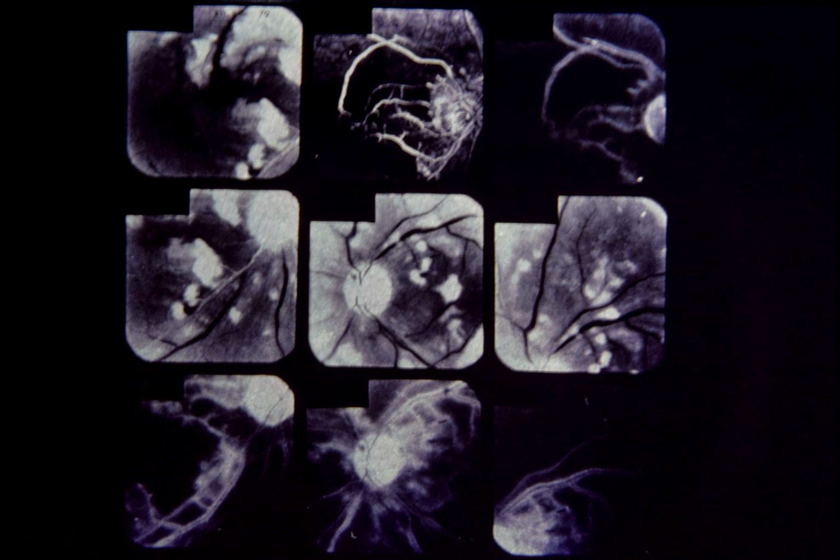Upper center, note marked capillary non-perfusion in areas corresponding to cotton wool spots. Upper right, reduced flow through arterioles has caused hypoxic damage to vascular endothelium, resulting in dye staining of vessel walls and dye leakage into retina. Center left, note cotton wool spots beneath right disc.